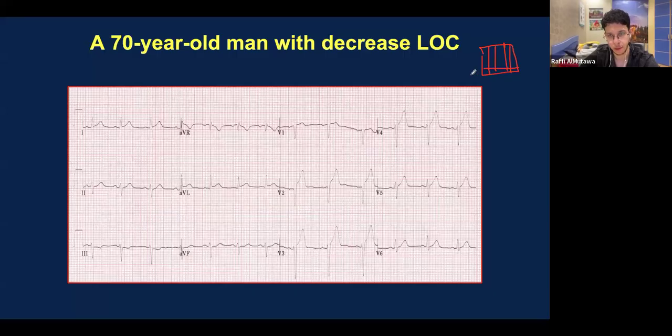If the P is here and the ST is here, this is the J point, and the PR is at this level. This 1 millimeter for almost all of the leads is enough to say this is an ST elevation. For V2 and V3, there's like 1.5, 2.5. Again, very nitpicky. Don't focus on it too much.